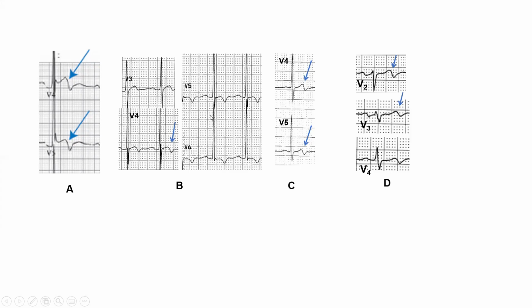Case B is a very important one that is very common, and I want you to know it well. What is the diagnosis here? Look at this. You're having a biphasic T wave with a straight convex ST in lead V4 and a little bit in lead V5. What is the diagnosis here? And look at the QRS. This is a 45-year-old severely hypertensive man. I'll tell you the diagnosis. Yes, it's LVH with a strain pattern.